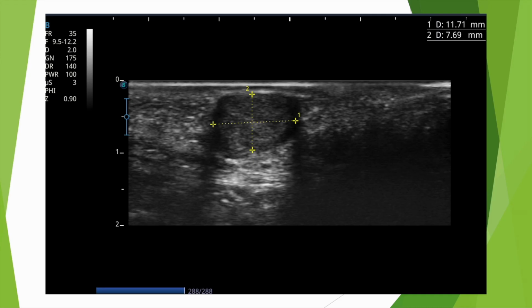We get this. And now let's take the opportunity to review the 3 diagnostic criteria for a cyst. So the first thing we see is that it's not anechoic. Here we have an echogenic image. This is where the biggest interpretation trap happens, especially for beginners.